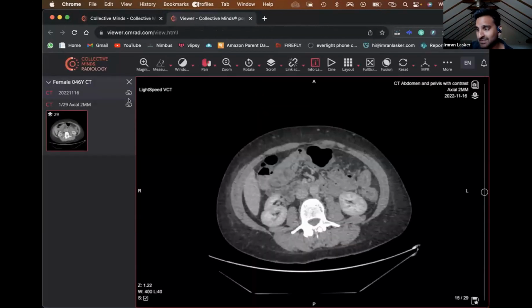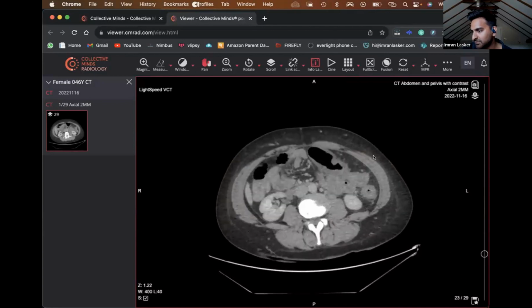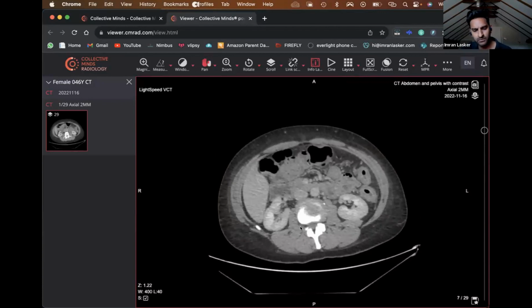We're going back to CT, and we're going to have a look at this particular case. So this is an adult patient. They've come in with abdominal pain, and this looks like it's jumped for some reason. I don't know why. So renal malrotation? No, I don't think so. I think if we draw the kidneys, they look like they're there and there from the kidneys that we can see.